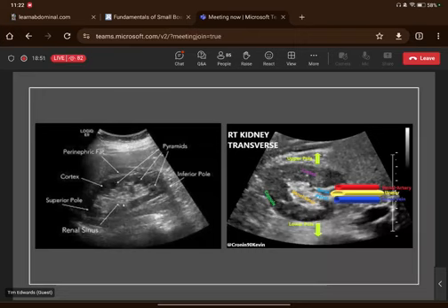These echogenic areas here, something that seems to come up on questions quite a bit, practice questions. This is renal sinus fat. So on an ultrasound, if you see that on a slice and it's pointing to this very echogenic material, then this is renal sinus fat. So again, showing the cortex, medulla, and the renal sinus.